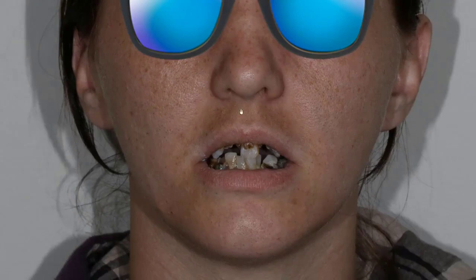And then a picture of their smile, and a picture of lips at repose, but with them apart. Because what I'm looking for here is to reference where their existing incisal edge is at repose. So she's a young lady in her 20s. She shows quite a bit at repose. And so this is probably, I would say, appropriate for her smile. We just obviously need to fill in the gaps here.